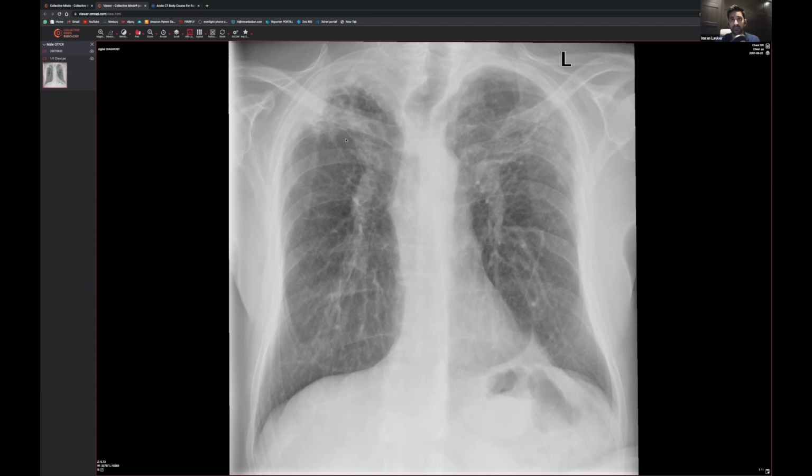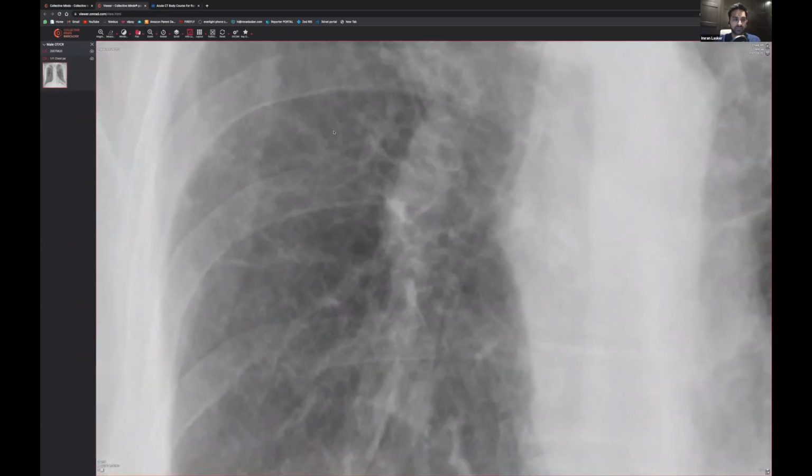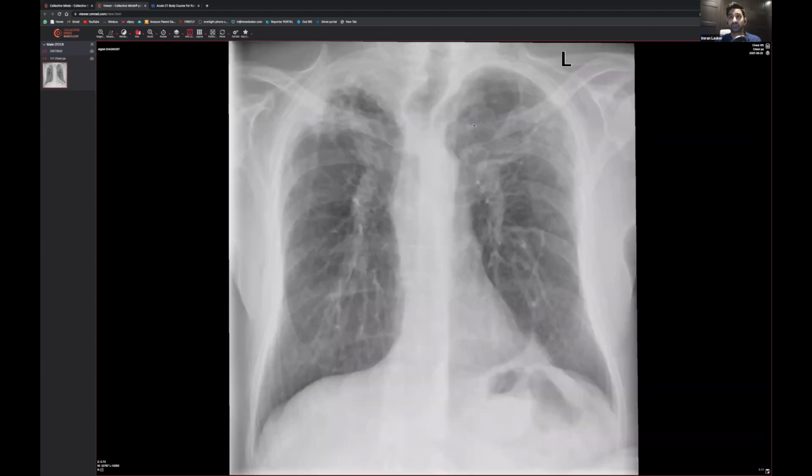So in this particular situation, do we have a pneumothorax? Doesn't look like it. It looks like all the linear lines go all the way to the edges, all the way like so. So it doesn't look like a pneumothorax. The one thing I'd always say is genuinely when I'm looking at x-rays in the first instance, I do look at the apices to make sure that I can't see a linear line going along like this to suggest there's a really small apical pneumothorax. And I've seen a few of those get missed just because they're really, really small. So very important. Some really great answers coming in already.